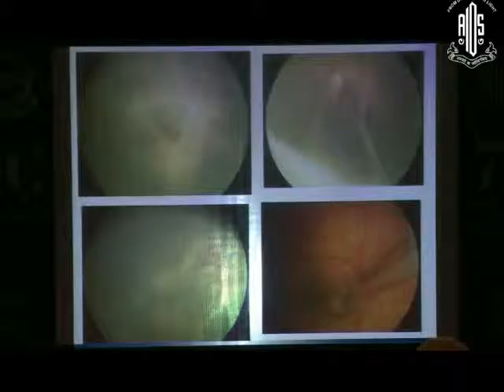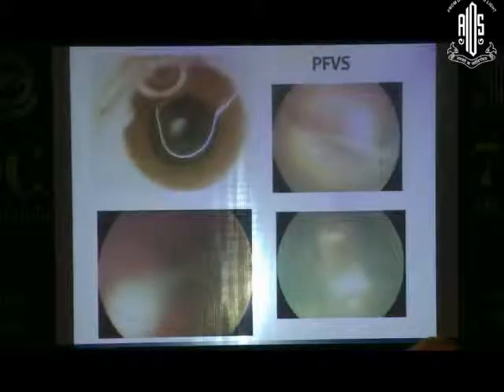So a double falciform fold is another feature that you can see. A very, very vascularly active NVE with an amazing amount of ischemic retina is the other thing, and dysplasia is the other thing. But the most classical one that we know FEVR to be, especially the cicatricial form, would be that, which is the falciform fold.